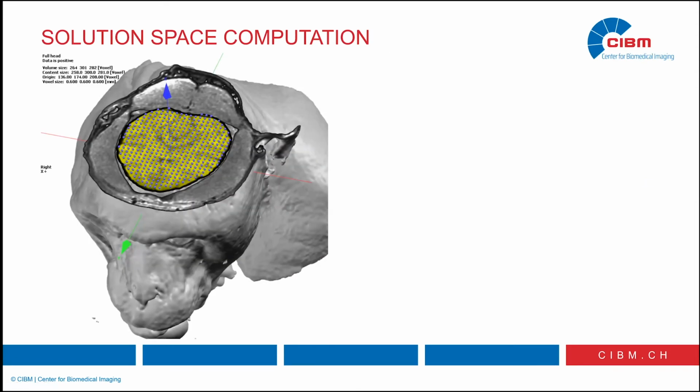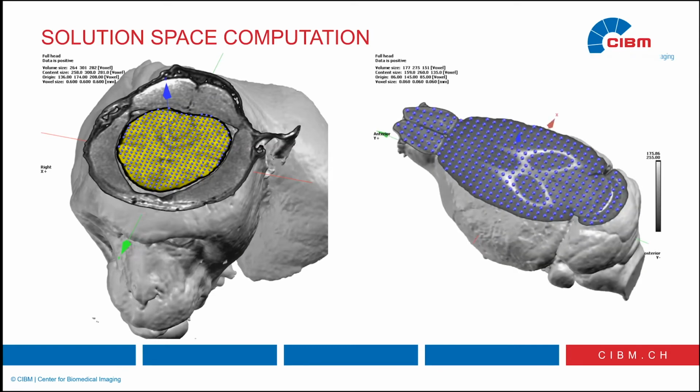The monkey is back. So we can also work with monkeys. Also the same thing, you take the whole brain because the gray density is not the same as human. And the mouse is back too, taking all this solution space into the mouse brain. Still again with the same package, didn't change anything.